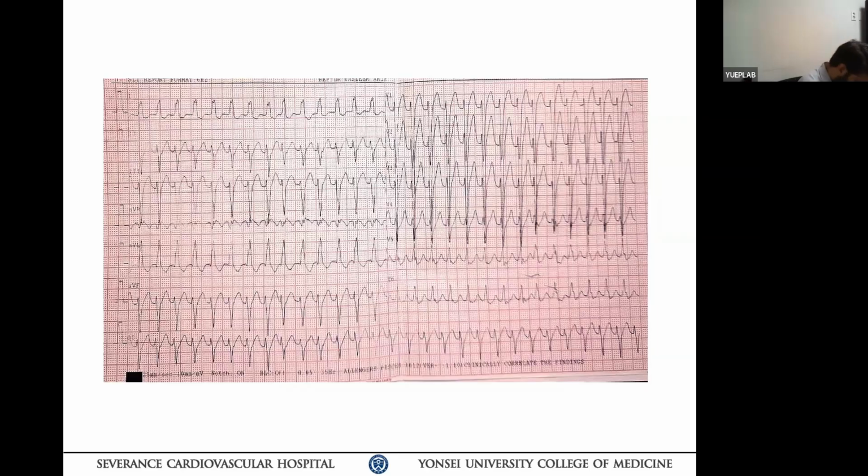And in V1, the transition comes in V4 or 5. Looking for the P wave. Okay, 5 seconds.